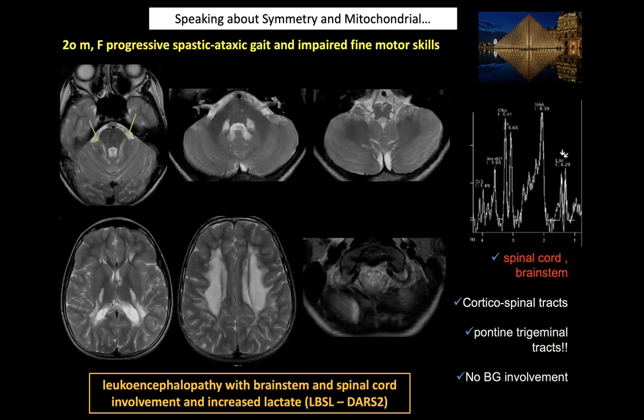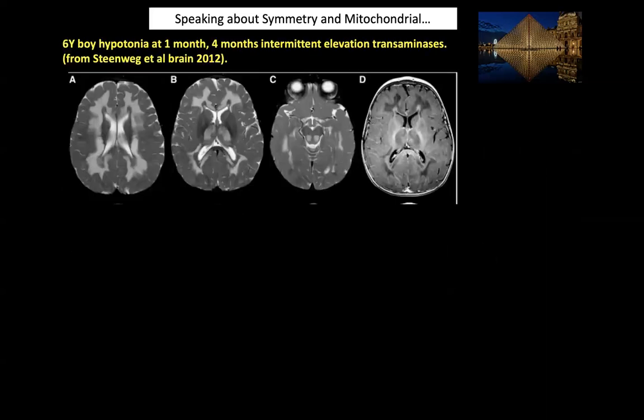These are tRNA synthetase genes, but this pattern is very typical. So in this case, you can suggest the gene, but also you can suggest mitochondrial leukodystrophy, and your colleagues will take it from there. Another typical pattern, another ARS gene with leukodystrophy. In this case, the thalami are completely involved. The posterior brainstem is also involved.